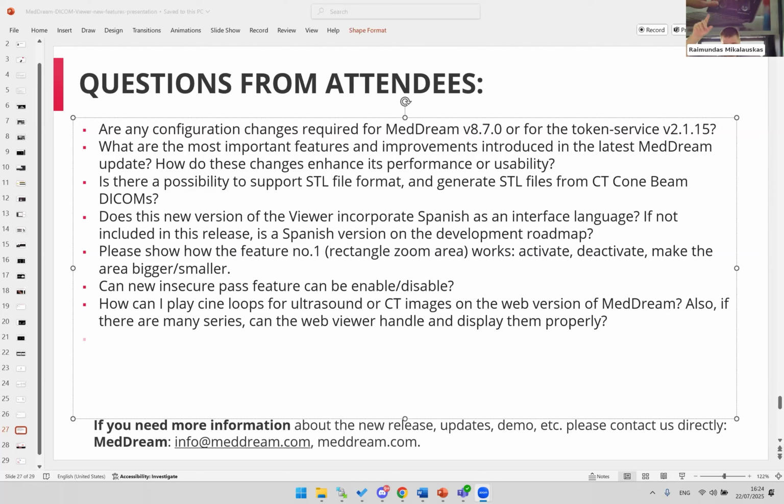It's like taking a mammography study in full size and making these quadrants equal. So at least you can't make the area bigger or smaller. And of course, it depends on the resolution of the computer monitor. But we still have zoom functionality which the user can use and check.